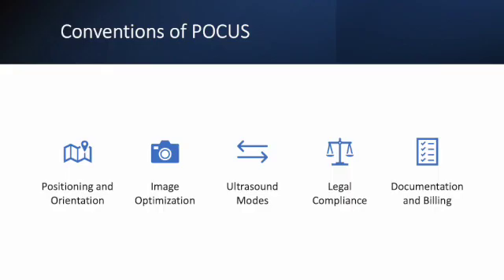This lesson will go over some of the conventions of point of care ultrasound use. We'll talk about positioning our patients for exams and how we position and orient the probe so that we can obtain the images that we're looking for. We'll talk about the different machine settings and techniques that we can utilize to clearly see the intended structures of each exam. And we'll talk about the different ultrasound modes, what they represent, and how we recognize them. And then we'll end our time today talking briefly about the legal and logistic clinic environment that we have to utilize this technology and what necessary resources need to be in place for us to be able to document and bill correctly.